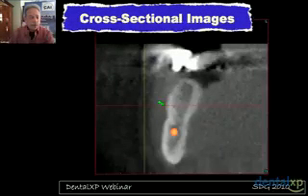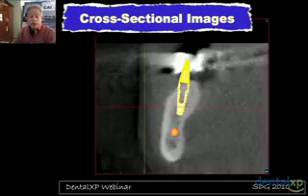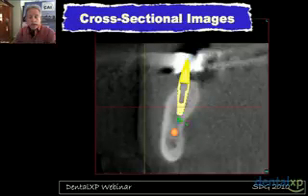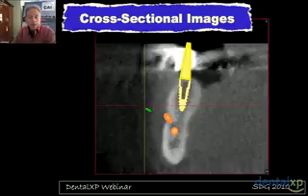And sometimes it's kind of an eye-opening experience when we're looking at individual patients. We can then place a virtual abutment, and we can try to avoid the concavity that exists in this particular area, as you can see here, and also give us a zone of safety above the inferior alveolar nerve. So when we have that capability, we can even place an implant in areas where we might normally not place it, above the mental nerve. So here we can see where the mental nerve exits through the mandible, and that really is an amazing evaluation.